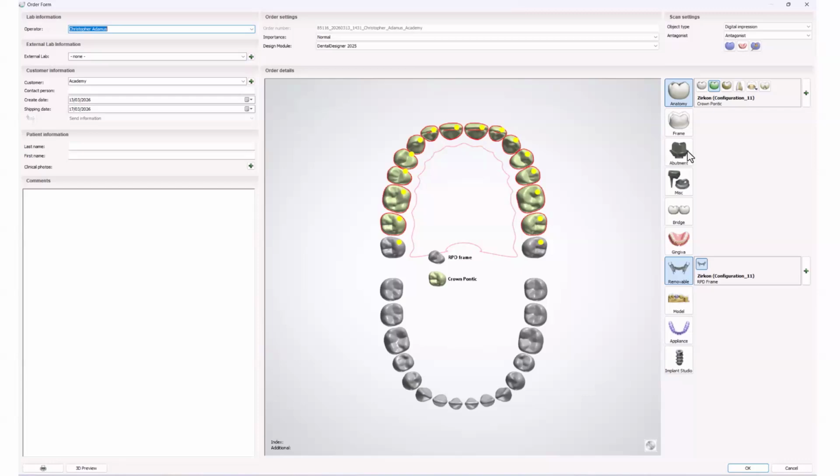If we will be doing the RPD module, of course, we can add anatomical shapes of the teeth quite easily. But the gingiva option, we're going to be using a major connector there. So the gingiva option is not going to be looking as elaborate and might require a couple of minutes of, let's say, waxing up to give it more anatomical shape, but it's also doable.